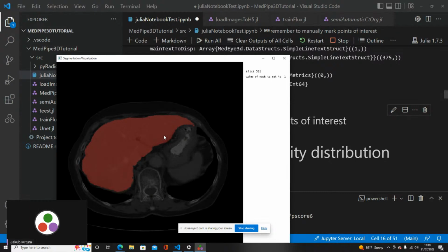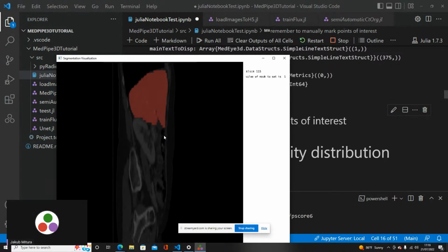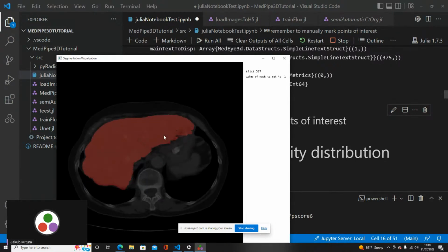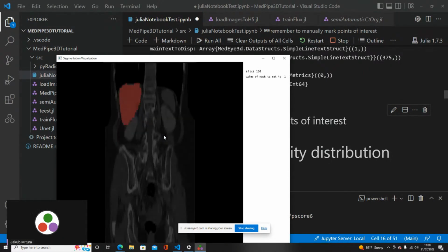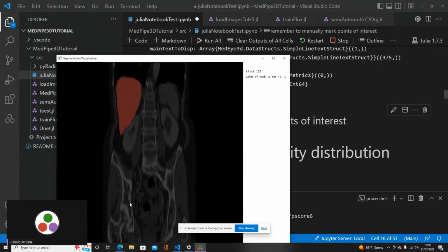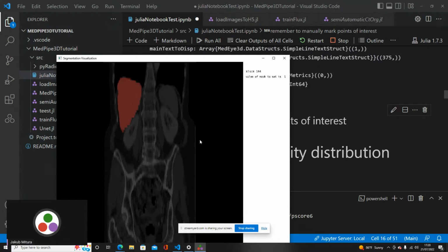Okay, and one more time. Yes. And now I change this to 0.5, yes, and we see that it's elongated. We are not so high, we are not so thin, let's say. And if you look at the hips, for example, we do not have such a long hip relative to the rest of the body. So this is what the spacing means, basically: if we get the spacing wrong, we get the distances wrong, and we lose a lot of information.